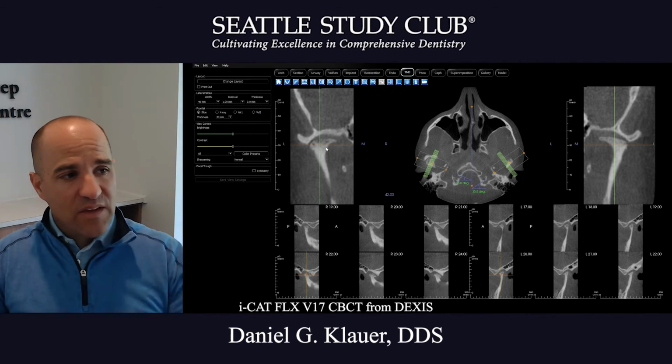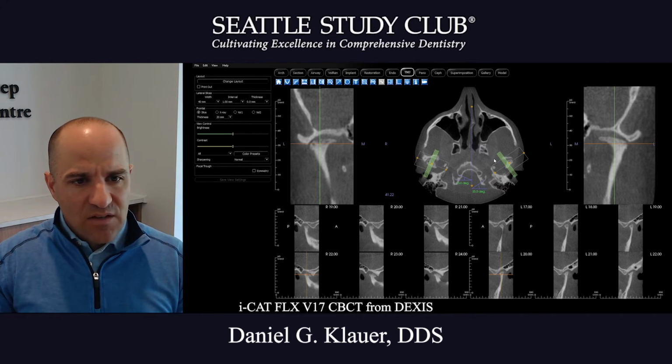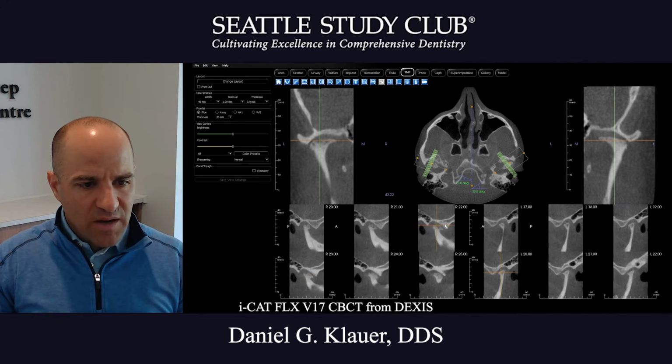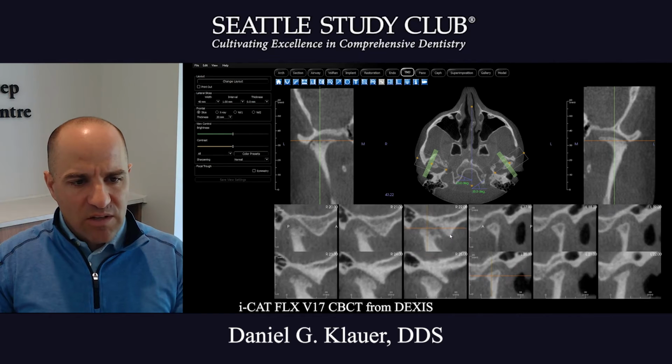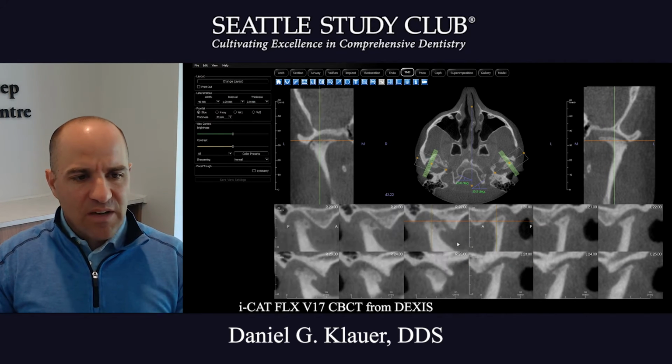It's going to be tough as some patients aren't symmetrical, so they're going to be in different planes. If you go to move one of these and not the other and both move, the symmetry button over here might be clicked, and so you want to unclick that. So then I bring both condyles into the field of view. And then by holding the control button, I can zoom in, and by holding the shift, I can toggle. And that allows me to look at the joint then in all three dimensions.